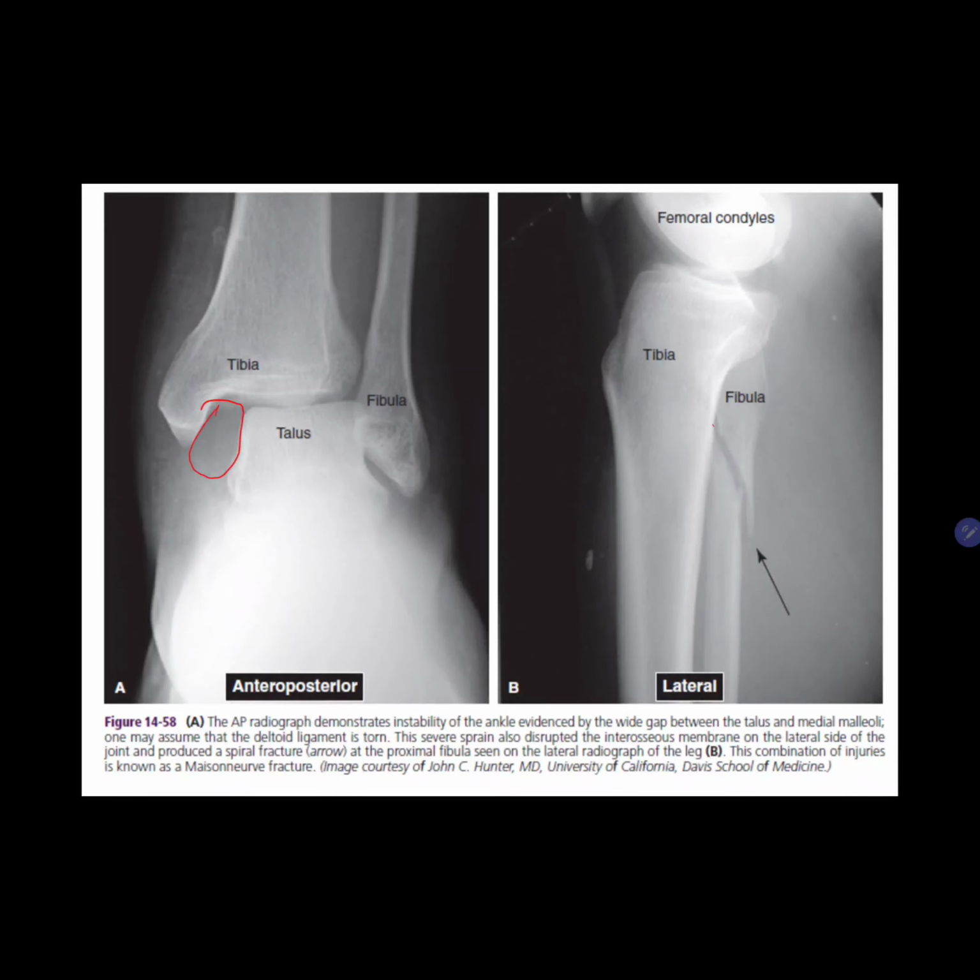Patients with anterior ankle impingement may develop spurs at the tibia or talus. Having the patient adopt a lunge position that reproduces their pain may show bone-on-bone impingement on a weight-bearing radiograph. And a patient with posterior ankle impingement may show an enlarged posterior tubercle of the talus or an os trigonum, a common accessory bone at the talus that may become injured.